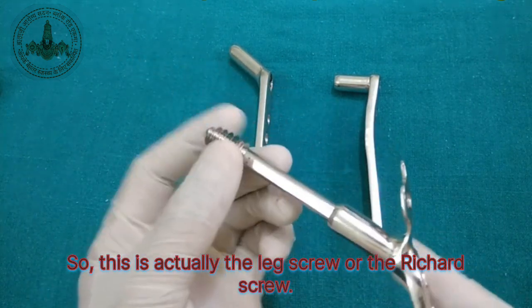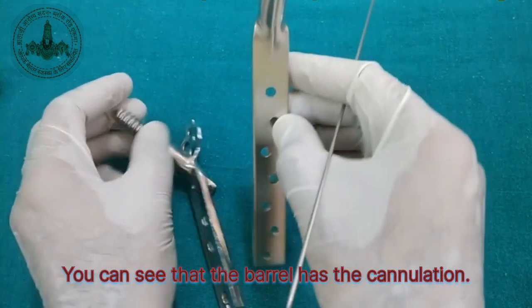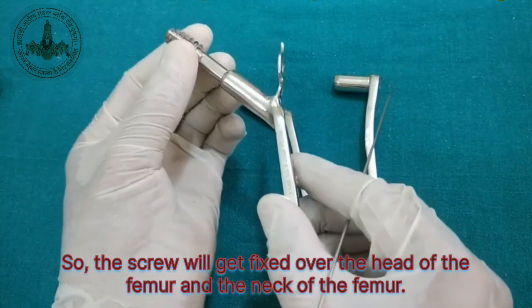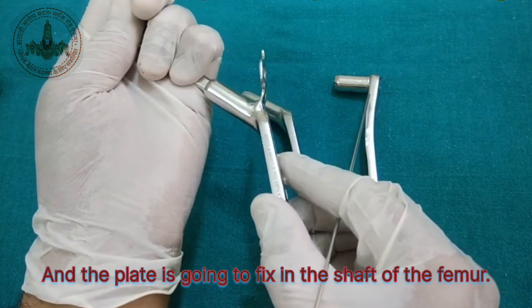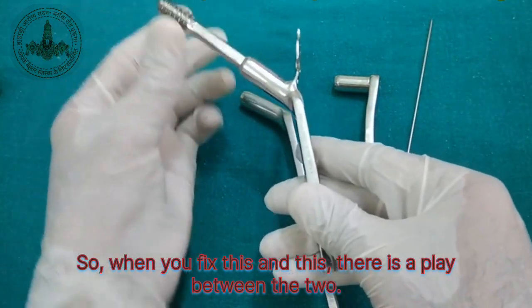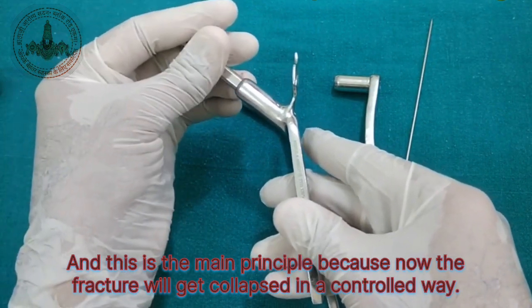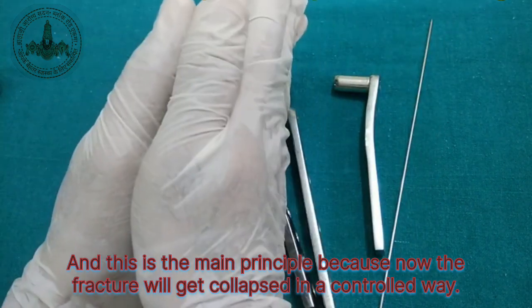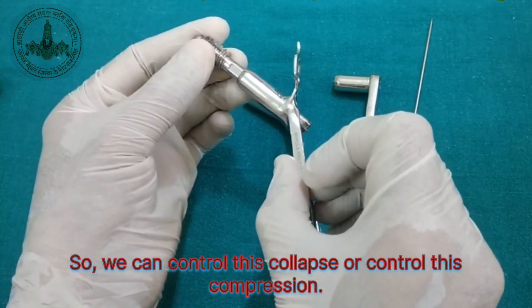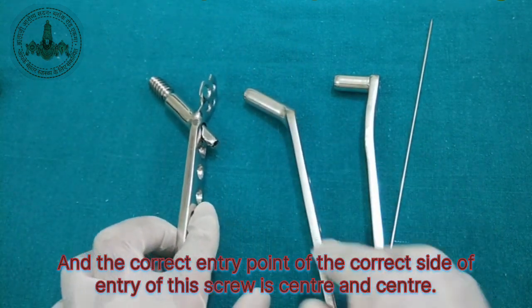So this is actually the lag screw or the Richard screw. This will go in this barrel. You can see that the barrel has the cannulation. So the screw will get fixed over the head and neck of the femur, and the plate is going to be fixed in the shaft of the femur. When you fix this and this, there is a play between the two, and this is the main principle, because now the fracture will collapse in a controlled way. We can control this collapse or compression, and this is known as controlled cancellous collapse. So that is the principle of the DHS.